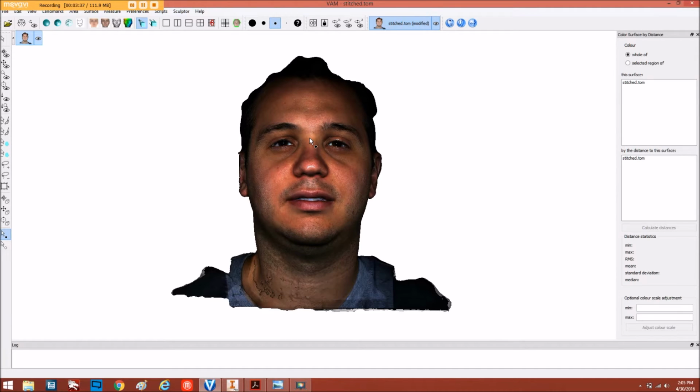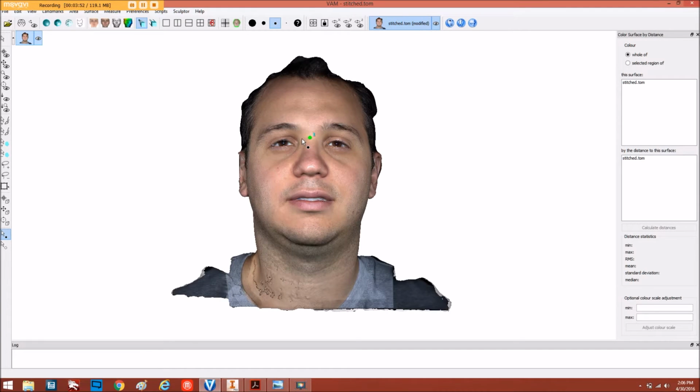And then we're going to transpose that, which, as I said, you can transpose on a piece of paper or you can do it on Autodesk Inventor. So I'm just going to be quick here. I'm going to put a landmark. I'll start right here at the nose, and I'm going to put a landmark right here. So I'm going to measure distance, and you can see I have in this case straight across, straight line between landmarks or across surface. So I want to do across surface. I want to show you the difference.